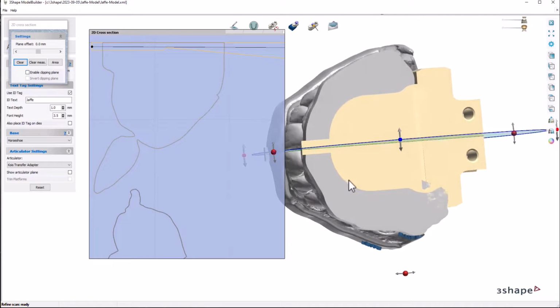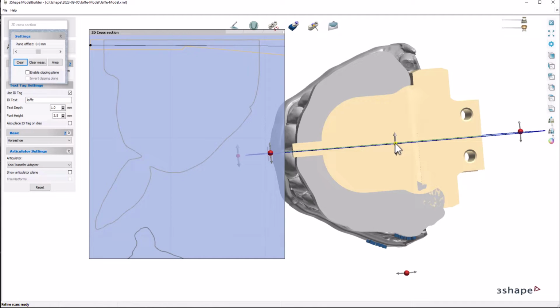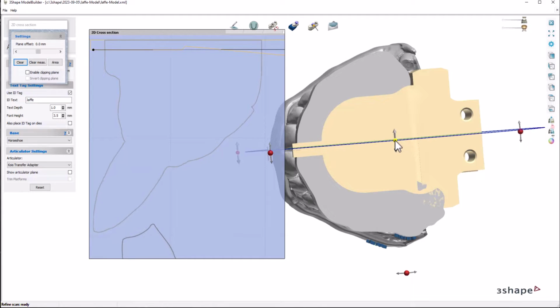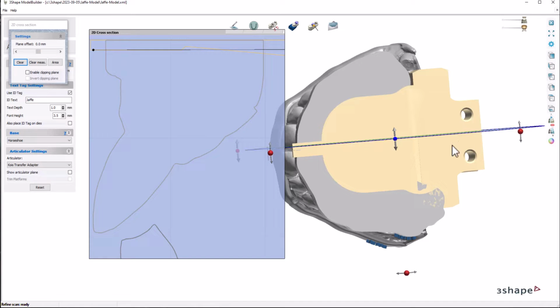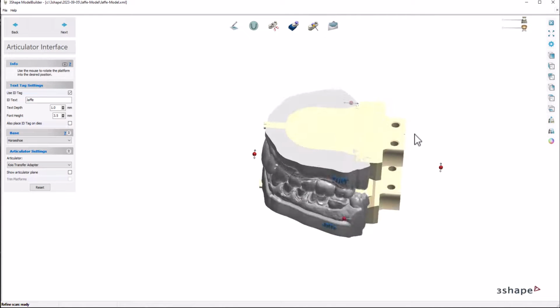Yep, it's right there on the edge. So we're at roughly 71 millimeters using this box as our guide, this main line. I could see that I'm pretty close to 71 millimeters. Now, I could probably take this and kick it back a little bit to be 71 millimeters.